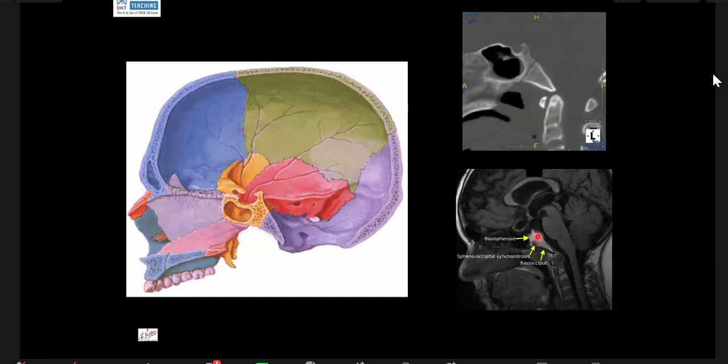And I've seen junior trainees confusing it with a fracture, particularly when you are on call, trauma cases, and people have reported it as a fracture. So don't do that, because in a growing skeleton, you will see this on CT.